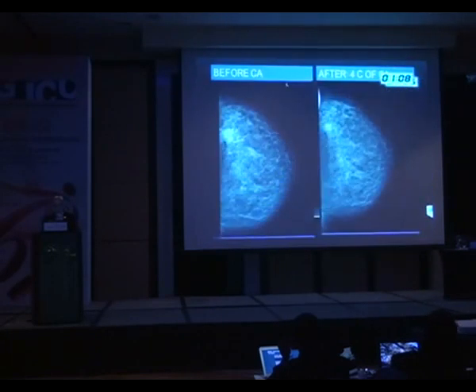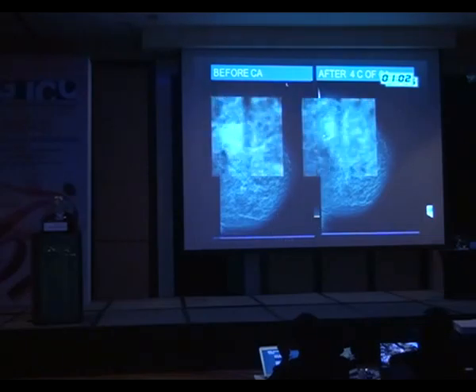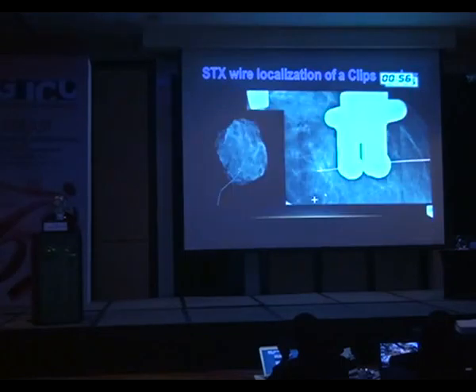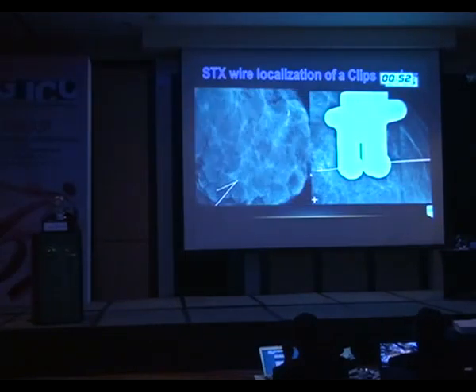Category 6, when the lesion is pathologically proven, here we have a breast carcinoma on chemotherapy with a clip inside. This is the proven carcinoma on follow-up, and it vanished after chemotherapy and then was localized. We localized the clip for further conserving surgery.